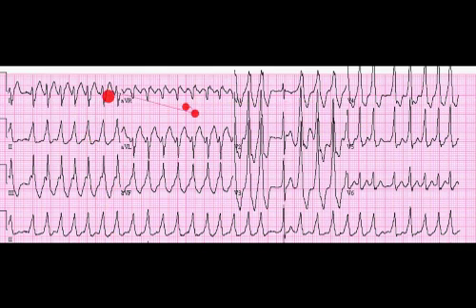And because the QRS is wide everywhere, one wonders, is this a patient with atrial fibrillation who has already got an IVCD that widens the QRS? One wonders that, because there is one space right in the middle where the QRS narrows down. And so that suggests that we're looking at a ventricular tachycardia type of message with a grossly irregular rate.